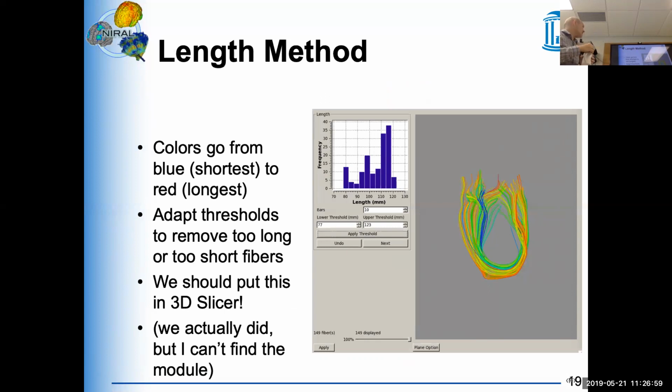Okay. Like a very simple way to... Fair enough. That's something that we could probably add. Awesome. As I said, we actually have a module that does this in Slice. It even shows these nice things, but I cannot find it. I'm sure somewhere it is. We'll find it. Otherwise, actually to create this, it's a great starting project for the incoming French students. It takes about maybe half a month to make this in Slice as a programming. So we can redo it as well.